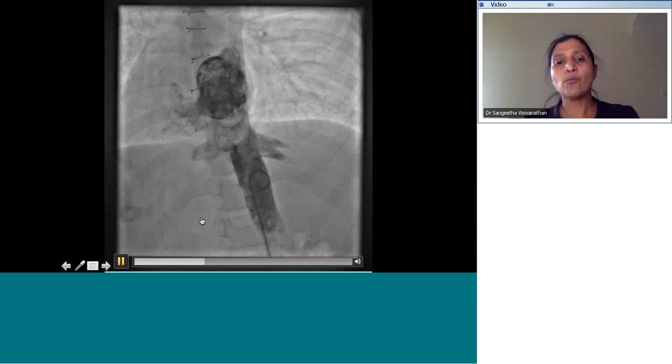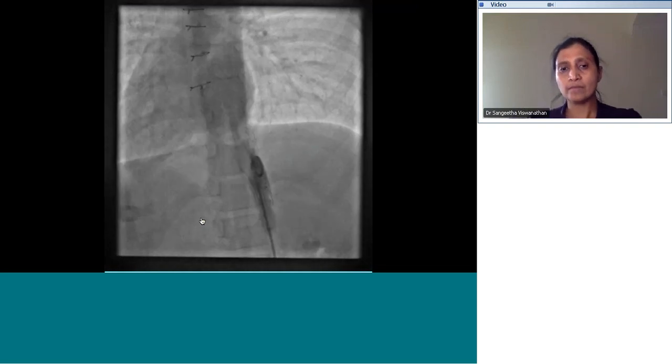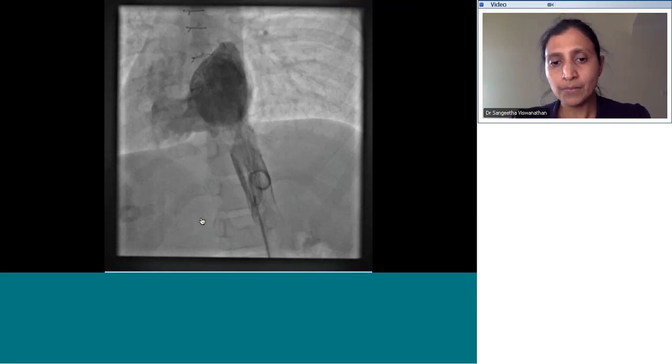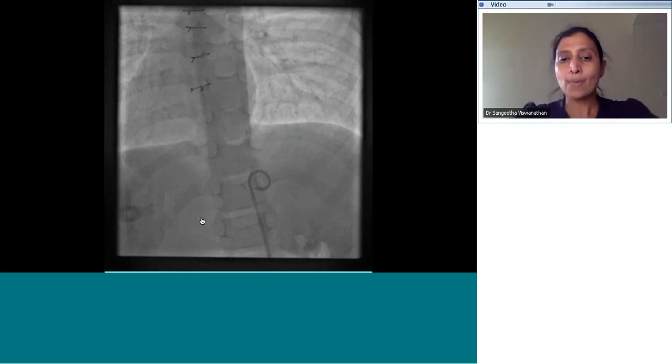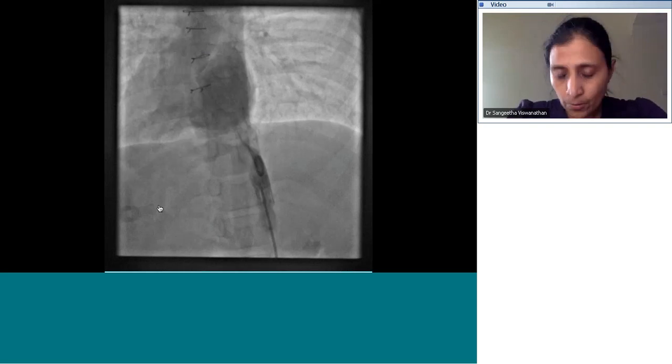Okay. So tell me, what does this angiogram say? You can describe the angiogram if you want. Okay.